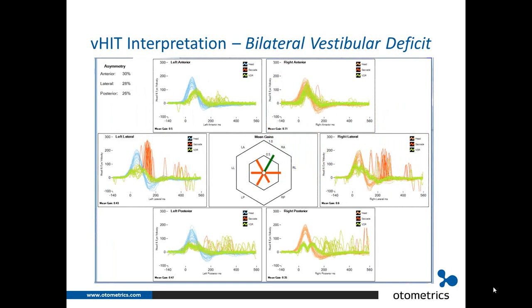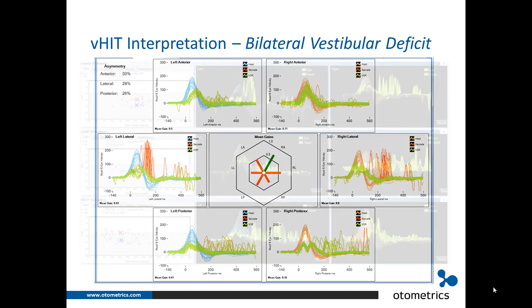Interestingly, this patient exhibits the same type of partial loss in all vertical canals. This is a hex plot of the results where the bars in the middle represent the VOR gain for each direction. As you can see, the VOR gains toward all 6 canals are reduced. The exception is head impulses toward the right anterior canal, shown in green here, which seems to be borderline.